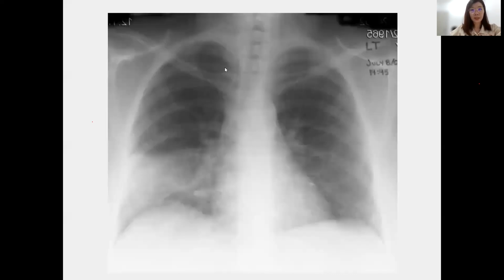Okay. So now this one again. This is a consolidation. Where is the location of this consolidation? The location interpretation is almost similar to a collapse, but this one appears as consolidation rather than collapse. So from here, we can interpret lower zone easier and faster. If you want to be more accurate to tell the lobes, then you can try as well.